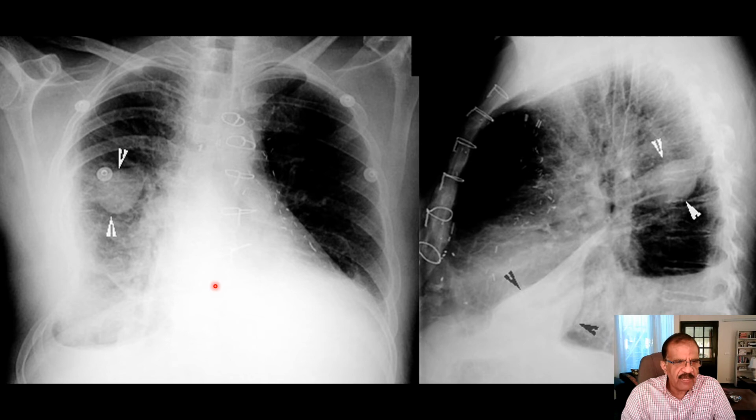Now this is another encysted effusion. You can see this one. This is not very clear, but if you see this one, and this one, I think if you trace the transverse fissure here, this is the encysted effusion in the transverse fissure. And this is another encysted effusion in the lower part of the transverse fissure. These two would look like opacity. In this case, this encysted effusion is this rounded opacity.